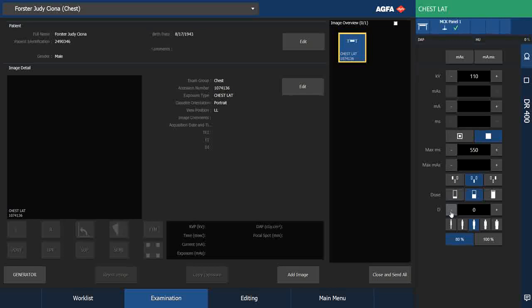There may be instances where you want to go up or you want to go down, depending on what the site requires. So this row here is a 5 selection patient thickness, and this is actually one of the features that gets used frequently. So using the normal process where an image gets driven by the APR selection from the RIS, the technique typically just needs to be looked at, and then this would be the next thing. If anything gets adjusted, it would typically be this.